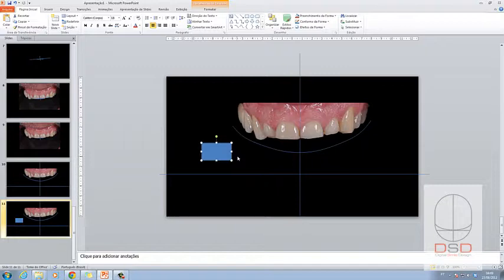Let's start, we have to guess a start, and let's say I want a rectangle with a relationship of height and width of 80%. So 80% will be, I want this rectangle to have this proportion relationship between the height and the width. So how are we going to do this?